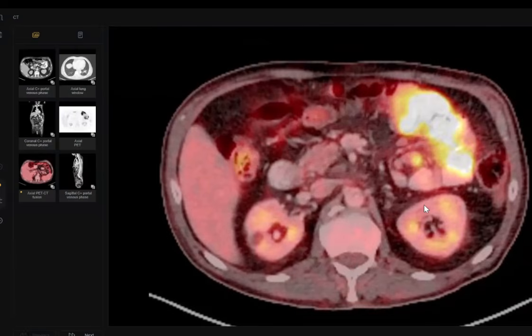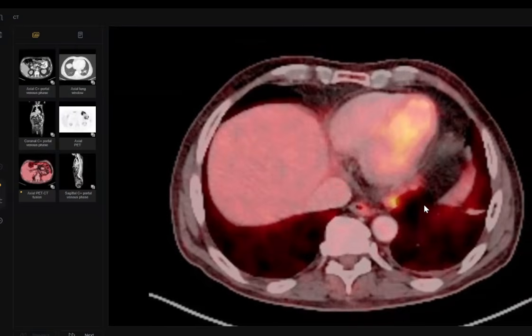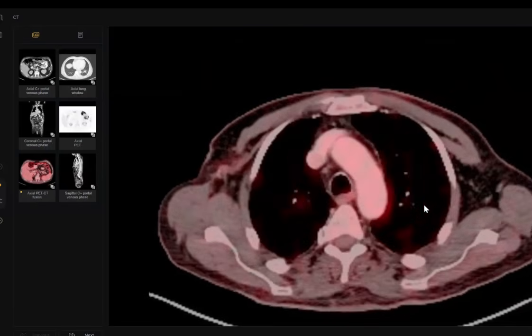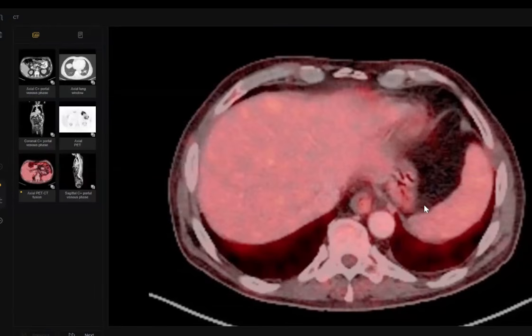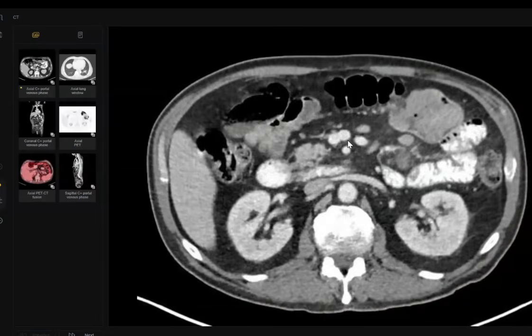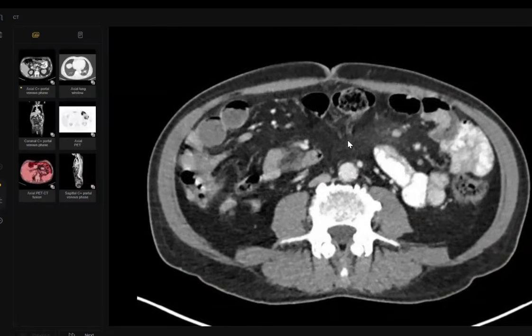So it was a metastatic melanoma. Even if you didn't pick up all of it, you must tell the examiner the major finding, like intussusception, very important. And by the way, this is not an emergency. Why?